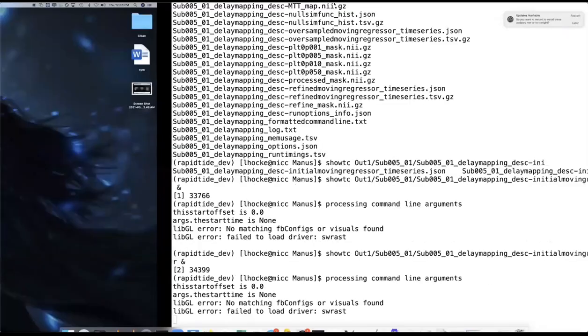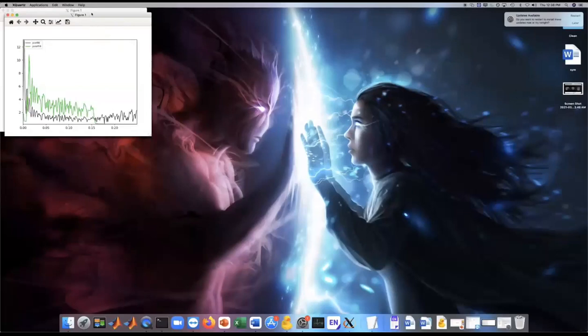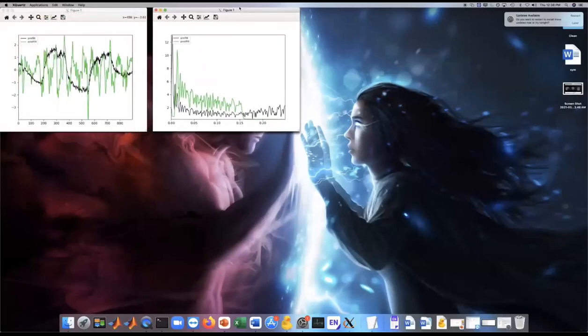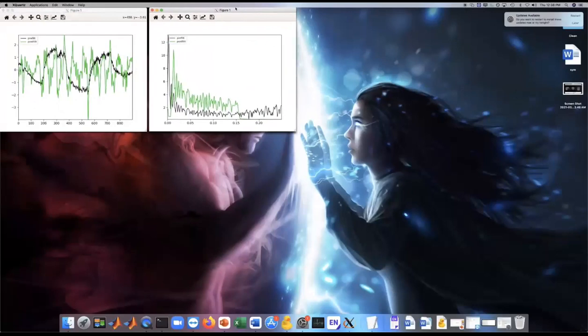And of course, we can look at it in the frequency domain here, and you see the sharp filter from 0.01 to 0.15 Hz in green. So the LFO band, which was the predetermined frequency domain, is above the original signal here in black, with high power below the 0.01 mark. So this is why we missed it.